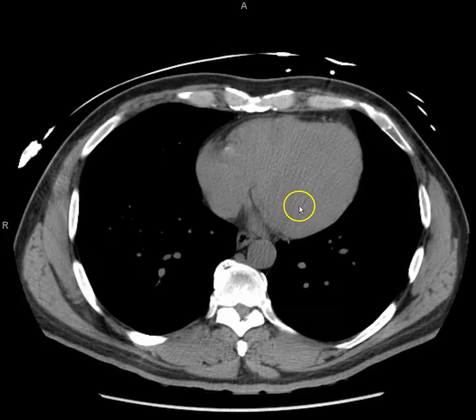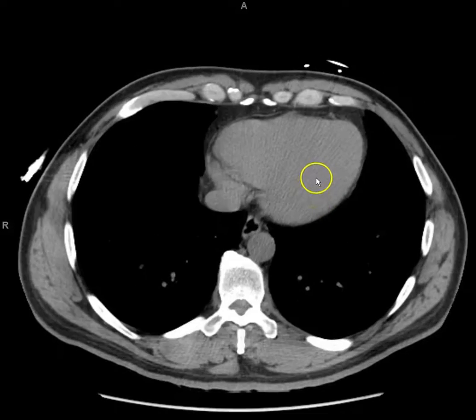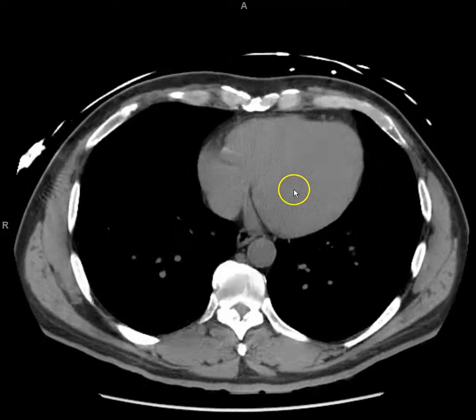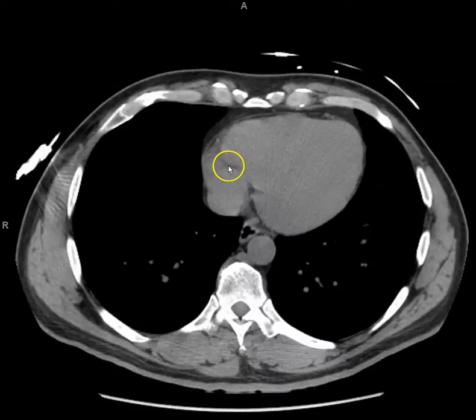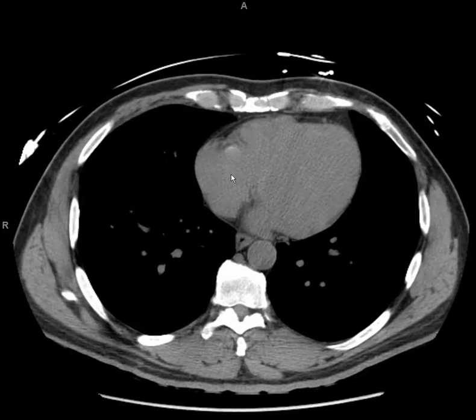Okay. What is this part? Ventricle? Yes. And the right ventricle is in the front, and then the left atrium is higher up, and I can't get to it. It's here. It's going to be just above this.